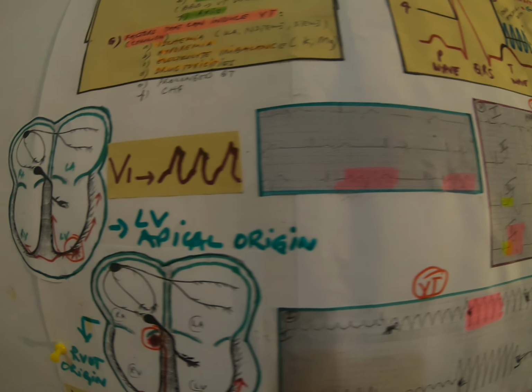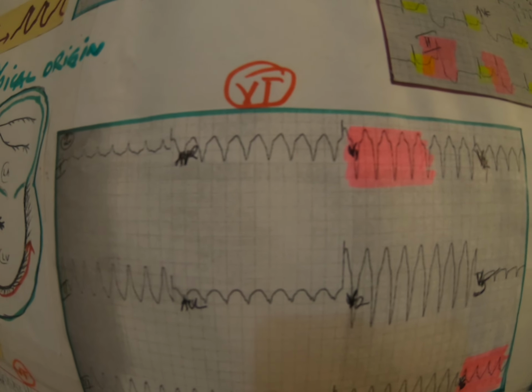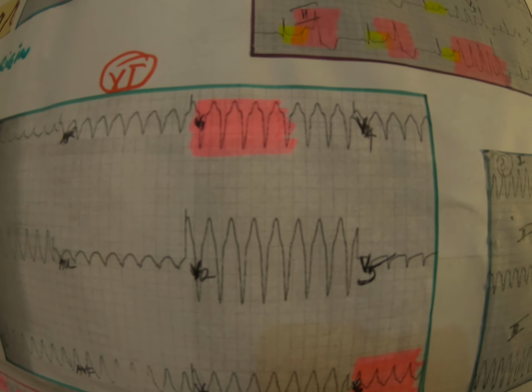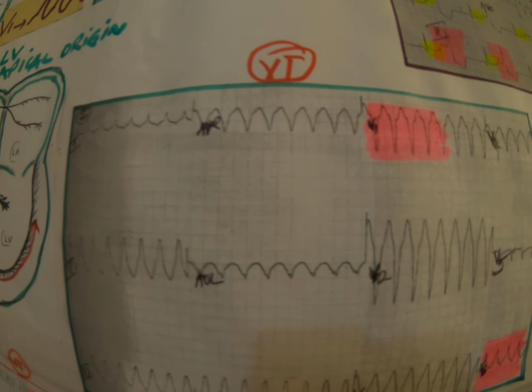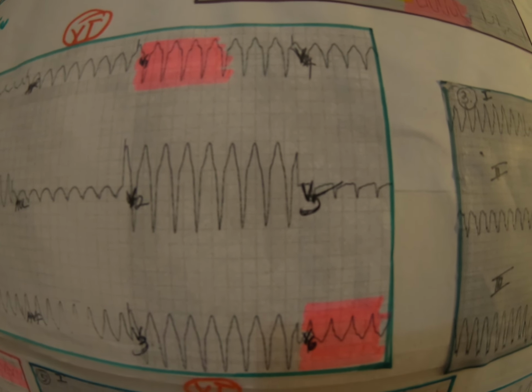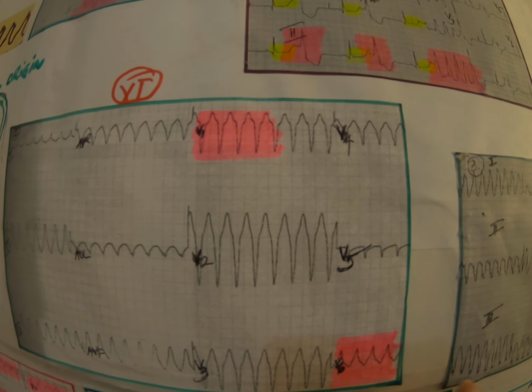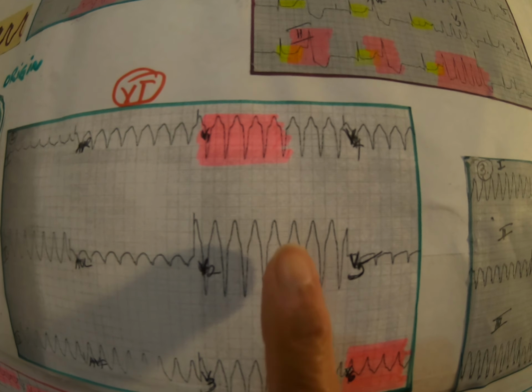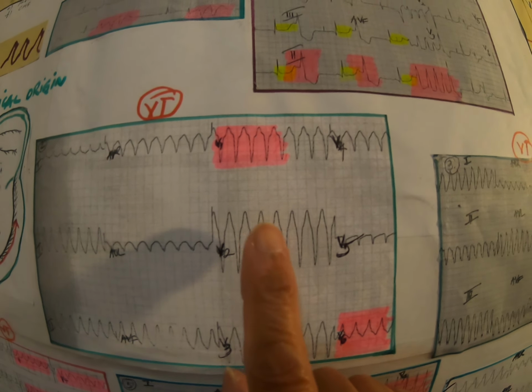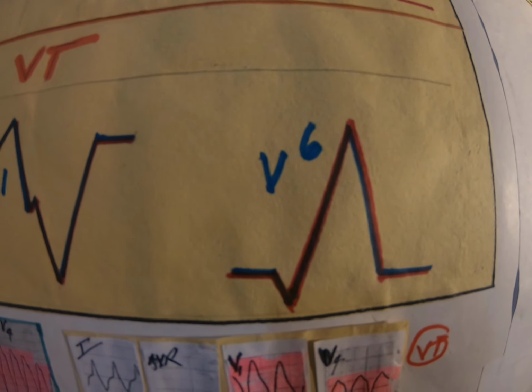Okay, so there is a VTAC ECG here, which is monomorphic. So as I said, when you try to read your VTAC, you don't read the limb leads. You go V1 to V6. That is your precordial, or chest leads. This is the one that you check. So you got here all negative deflection from V1, left bundle branch pattern. Okay, so downward, down, down, down, down, here not. But as I said, you check your parameters. In here, it's down, but on the V6, it's up.